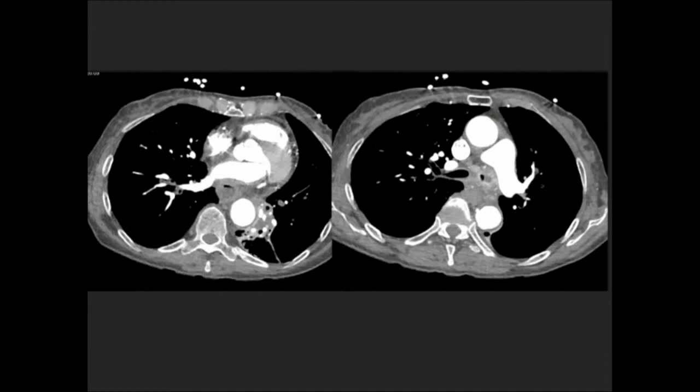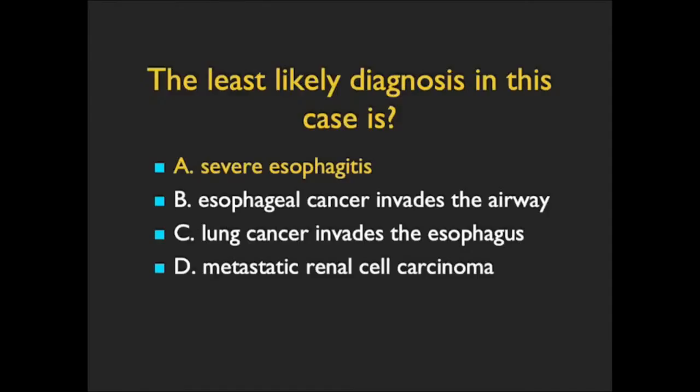This is not simply just esophagitis. Bad esophagitis, you can see free air, you can see some nodes, but you don't see the infiltration around the airway, and you don't see the extent of tumor as we see in this example. Just a very nice case.